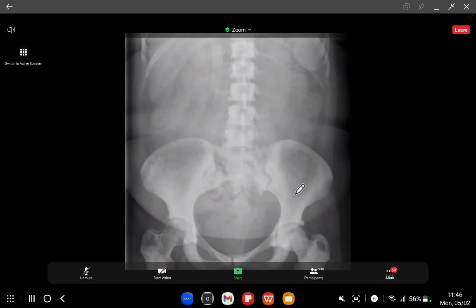Okay, this patient has got breast cancer. What's going on? They've got sclerotic bone mets, and what do you think's going on in the CBD? They've got a metallic stent, so it's likely that they've got intrahepatic metastatic disease, which is causing extrahepatic cholestasis by pressing on the bile duct here.